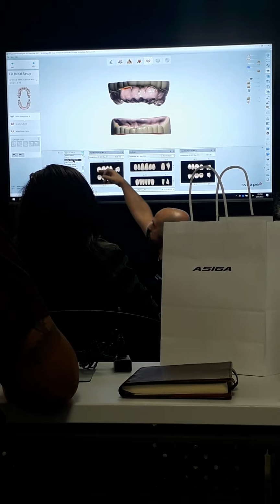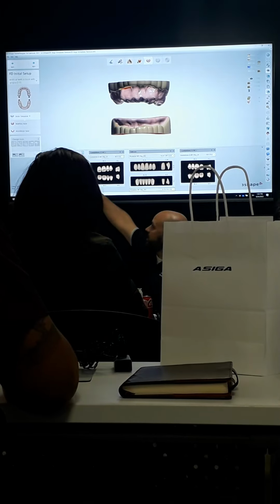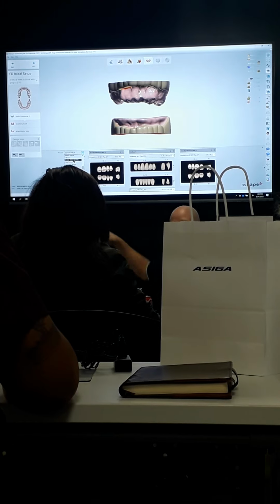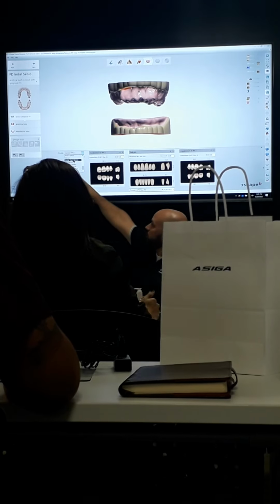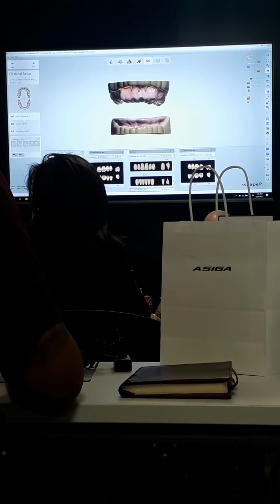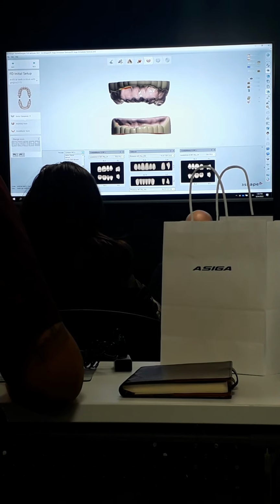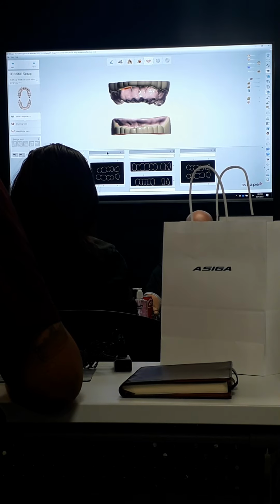So the DS Digital, those are the original libraries. And then these HC libraries here, these are for the new Dentsply material that's coming out, that high impact material. So if you know you're going to be using that, I would recommend using one of these 2 libraries. If you're just going to use like a regular PMMA material, use one of the other 2 libraries. I'm going to grab one of the new ones because I've not personally gotten to use these yet. I'm going to grab Portrait just because that's what we're used to.